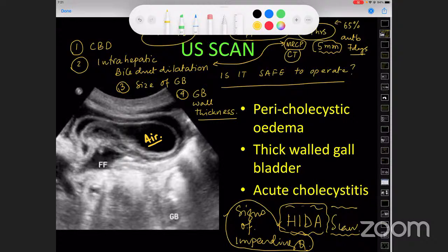Very good. Thank you, Avik. Can I just suggest that if you find air inside the bile in the gallbladder, would it be sensible to follow it up with a CT scan? Or what do you think? That's why I'm saying we need to go for a CT scan, a proper cross-sectional imaging. Multi-reformatted images could give us a good view of whether the fistula is between the gallbladder and duodenum, or the CBD and duodenum, where exactly the fistula is situated, and where the stone is going after the fistula, if at all it is going.